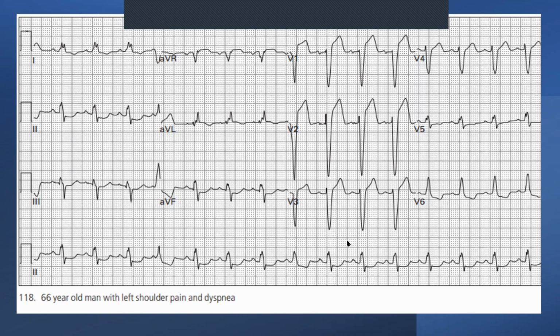Now, do we have a tachycardia? Let's look, 1, 2, 3, so 100. So we've got, well, you could say it's a query ventricular type tachycardia. It's not really a ventricular tachycardia, but it falls under that. Now let's look at each and every zone.